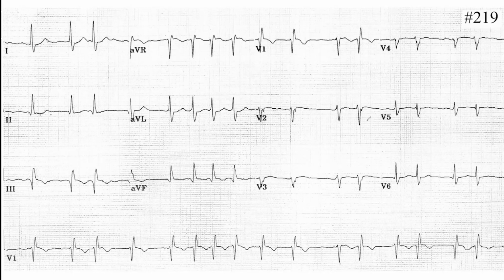Is it an SA block? No. Arrhythmia, no P wave. What did we say about that? Arrhythmia, no P wave. Atrial fibrillation. Don't forget, you don't need to see the fibrillatory waves. It's enough if you see only arrhythmia and no P wave. That's atrial fibrillation. Okay, move on.